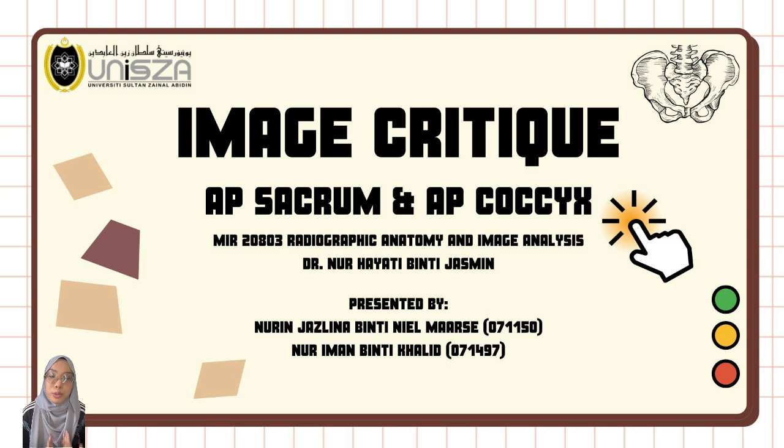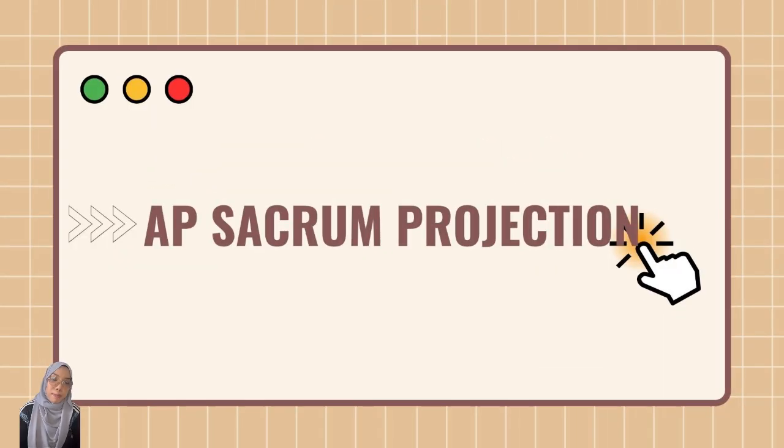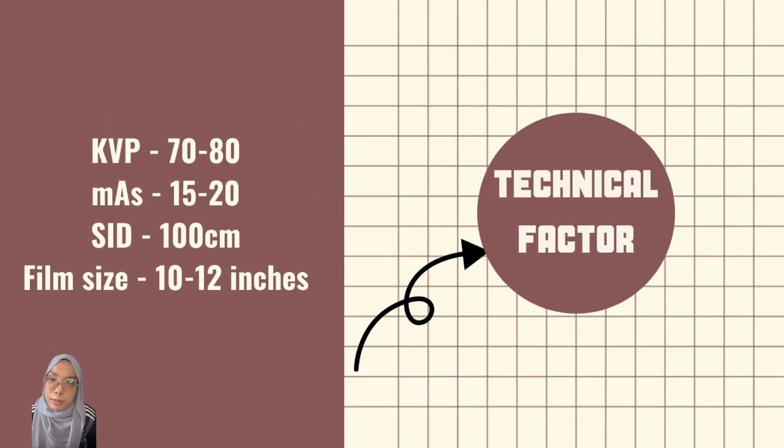We will be presenting about image critiquing on sacrum and coccyx AP projections. On my part, I'll be talking about the sacrum AP projection, and I'll be starting off by talking about technical factors.